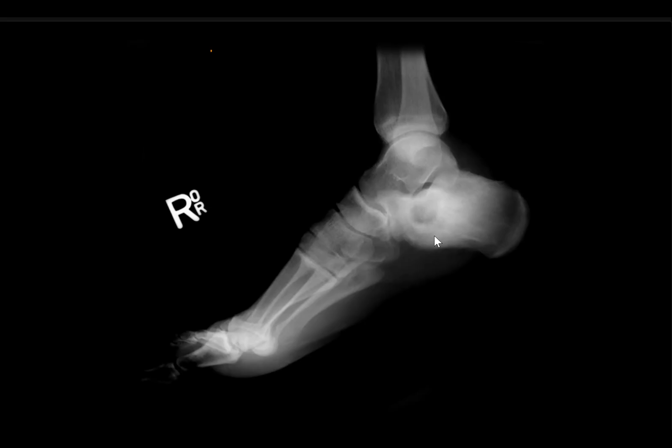in young age, Brodie's abscess accepted. Chondroblastoma is accepted also, because all tarsal bones are considered apophysis or equivalent to epiphysis. If associated with significant sclerosis, two or three conditions can be associated with extensive sclerosis: osteoid osteoma, but very small and cortical based; chondroblastoma, yes; and even osteosarcoma. Okay, what to do next?